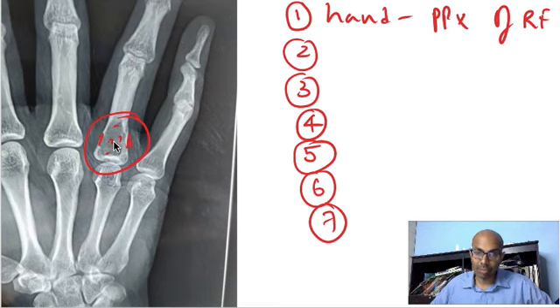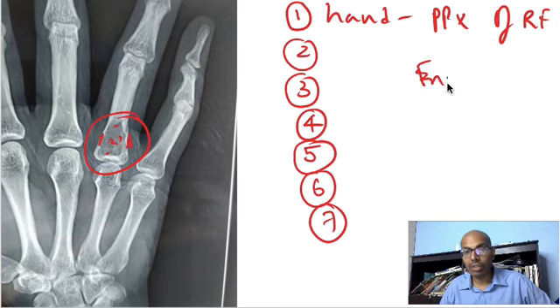There is some kind of popcorn calcification. It is a clear zone of transition. There is a zone between the normal and abnormal bone. There is no periosteal reaction, and there is cortical thinning. So what are the two syndromes that we know with enchondromas? One is called the Ollier syndrome. Multiple enchondromas is called Ollier syndrome.